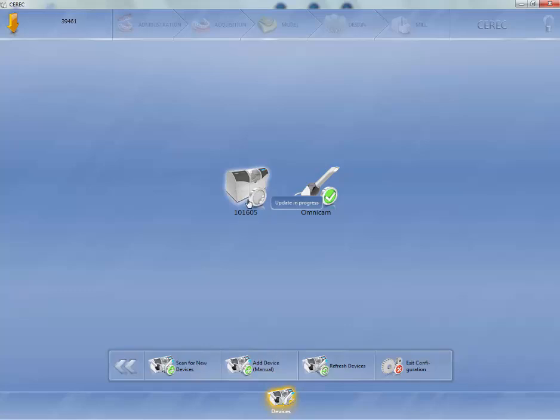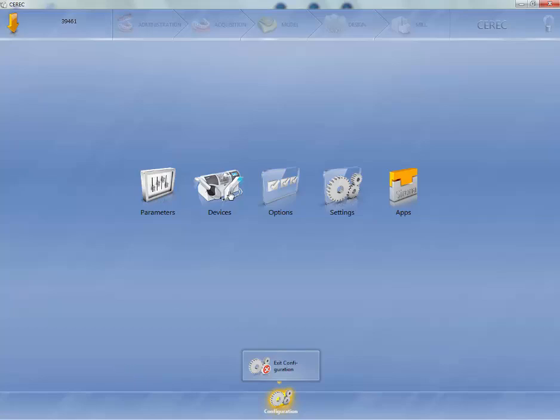and again, here's my machine. It's looking for the milling chamber. I don't have it, so we're going to go backwards again. And that's everything that I'd like to talk about. We're going to do another short video on parameters. So we're going to stop here, and then we'll do parameters next.